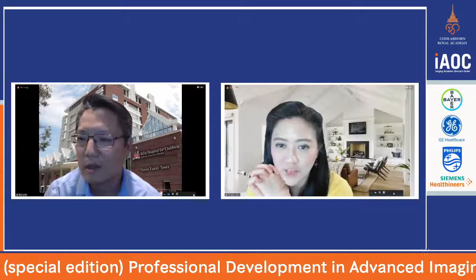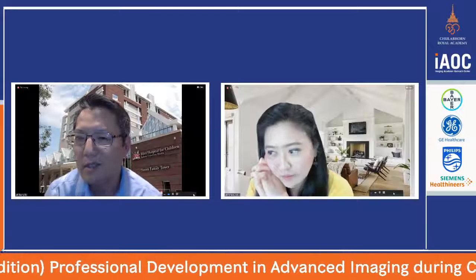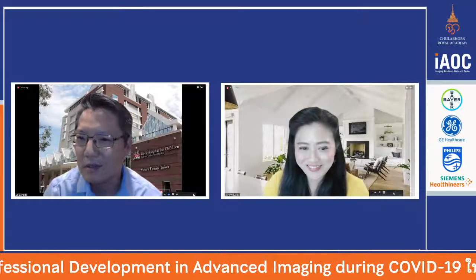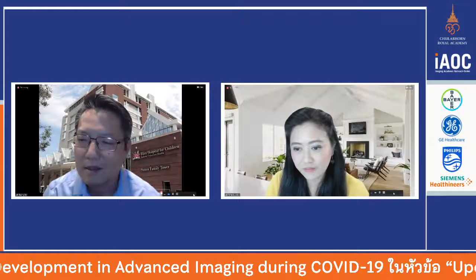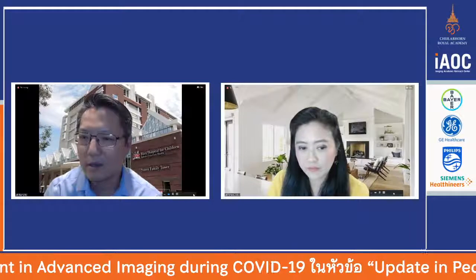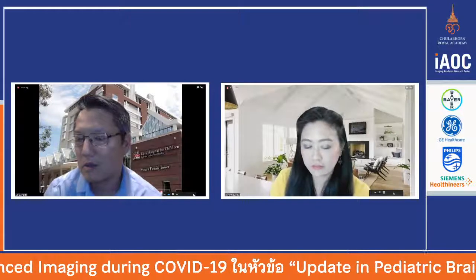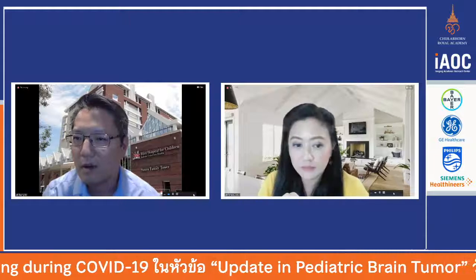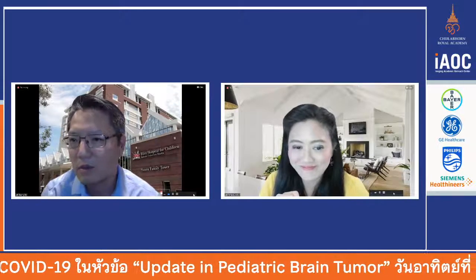Oh, okay, sure. So particularly for technologists, if you have radiologists asking for these perfusion images, now you kind of know why. They do take an extra 5 to 10 minutes to do, and then maybe some post-processing as well. So again, I was trying to show how our advanced imaging can really be used to correlate with some of the genetic differences. So it's very important, if we're doing perfusion, to make sure to do it.